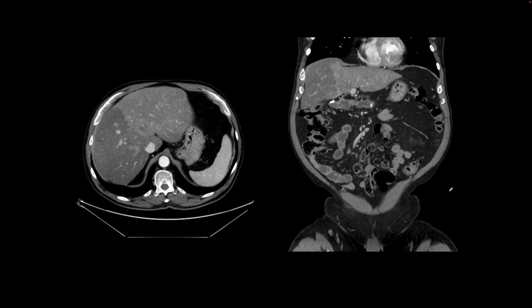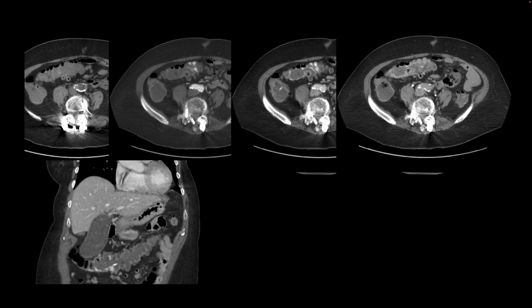This is our next patient. The finding was incidental, seen here in the enlarged liver. We have a part that shows enhancement, and there is almost like a geographic distinction from this posterior aspect of the liver that is fat infiltrated. And so this is called geographic infiltration of fat, and it's a benign finding, should not be confused with a tumor.